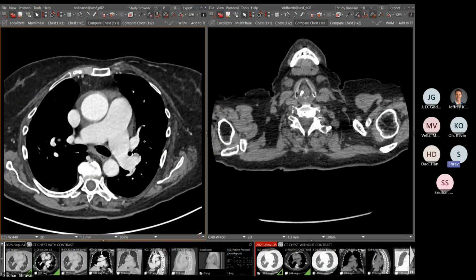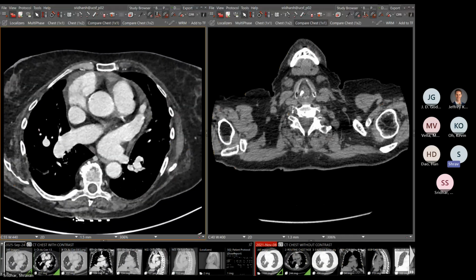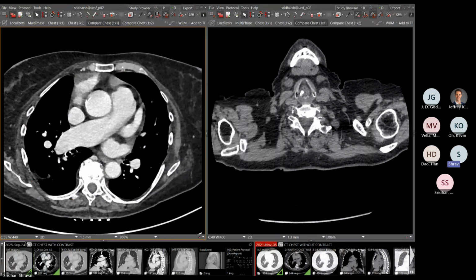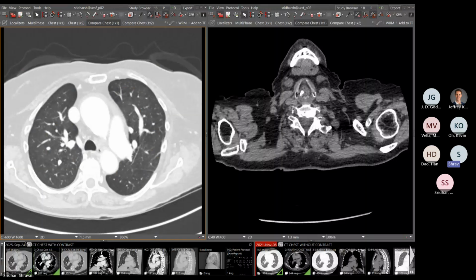Yeah, that's fine. So this next case is along the congenital spectrum here. It's a case of anomalous pulmonary venous return. So we've got a scimitar vein, but that's not the interesting finding here. The interesting finding is actually in the lungs.